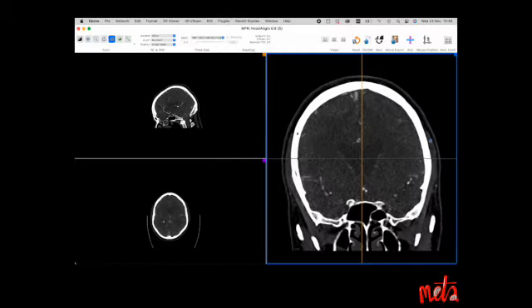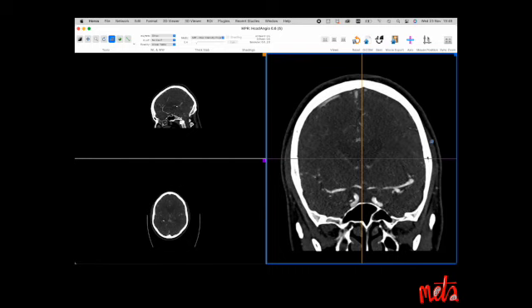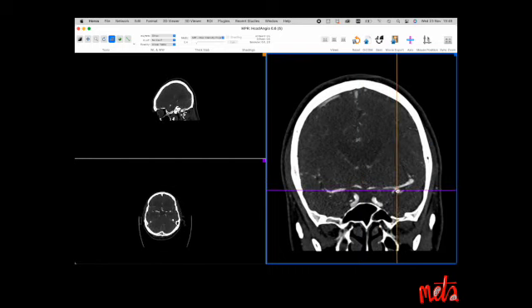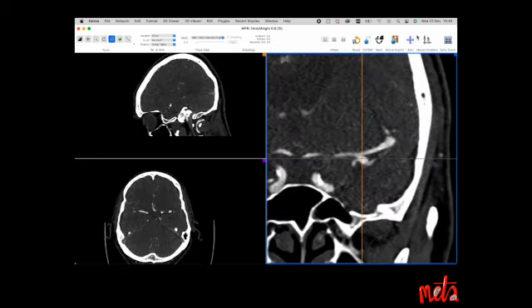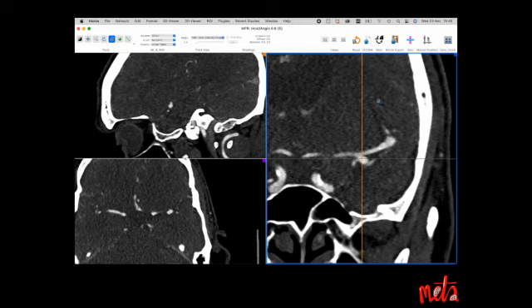So now we'll move on to measuring the left anterior temporal aneurysm. Again, this is the same process as before. So once you enter the multiplanar reformat, first put your crosshairs on the aneurysm. An anterior temporal aneurysm is generally inferiorly directed, so it's best examined on the coronal plane, which is on the right. So once you get your crosshairs into position over the aneurysm, then you manipulate the crosshairs in line with the parent vessel to show the neck in its best possible plane.